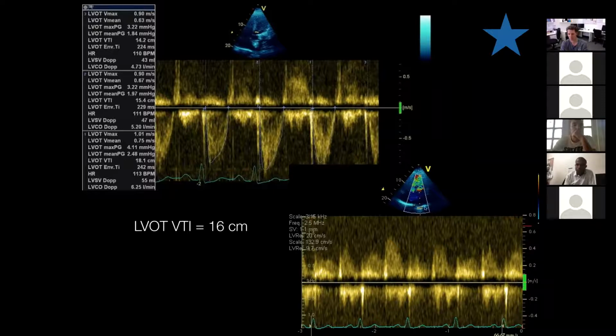I've got my pulse wave Doppler of the pulmonary veins, S wave during systole. So systole is the beginning of the QRS to the end of the T wave. There's blunting of that systolic wave, and a big old D wave in diastole, suggesting raised left atrial pressure. That fits the idea that we've got some significant mitral stenosis in there.